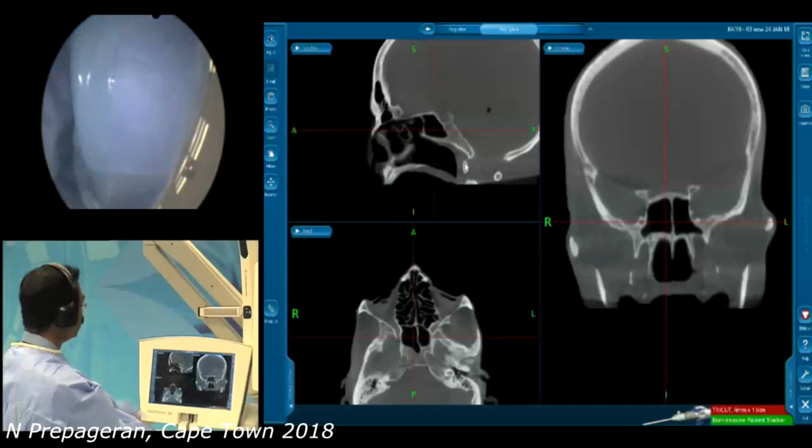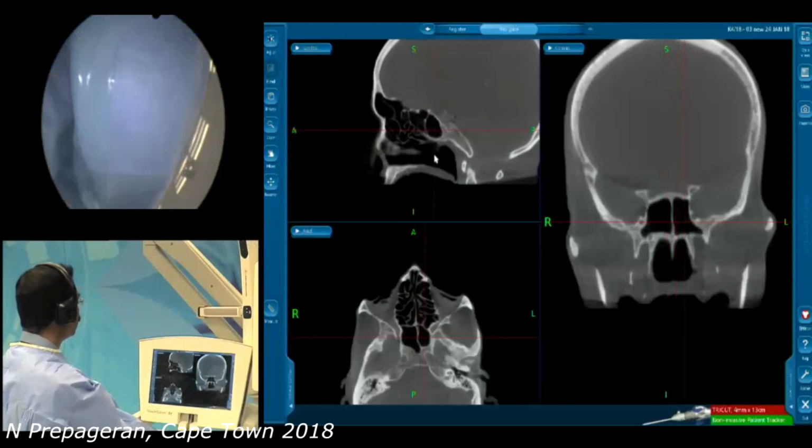But if you look at the sagittal cuts here now, let's start from the beginning again. So again, you can see the frontal beak. There is a very prominent pneumatization of the agger nasi here, as you can see. And you can see again how the uncinate process is sort of ballooned out, very pneumatized and compressing the frontal recess here with the agger nasi. There is a very large air cell from the ethmoid regions going upwards to the frontal region as well.